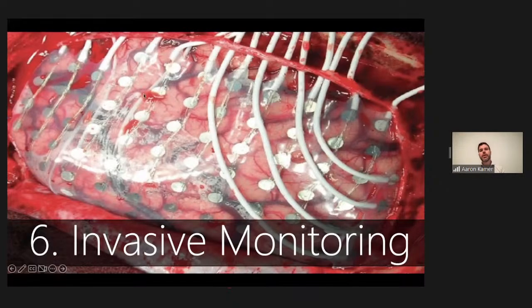We can do invasive monitoring. This is a fascinating tool to be able to use. This is something that's performed by neurosurgery, obviously. The patient has a craniotomy performed, and then the neurosurgeons use targeted monitoring of the patient in order to place either surface electrodes, which is what this is, or they can also place strips of electrodes that will go underneath the temporal lobe or under the frontal lobe.